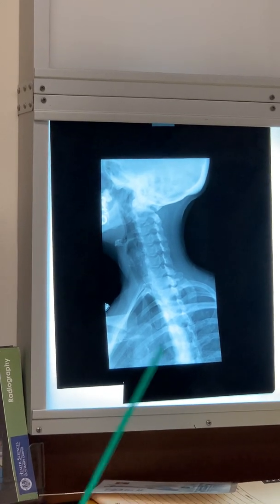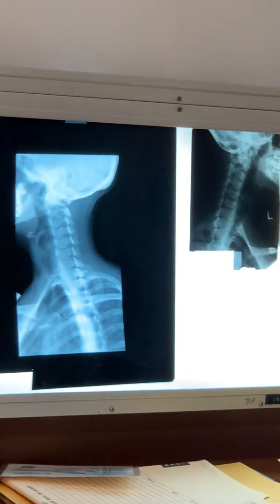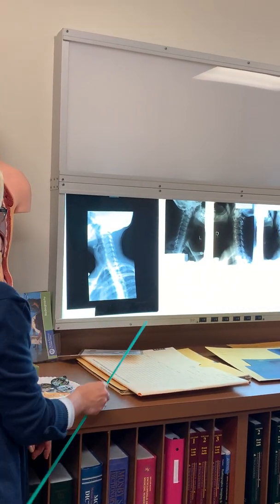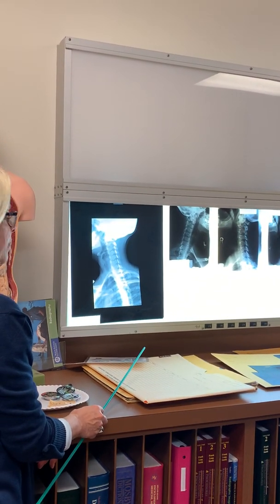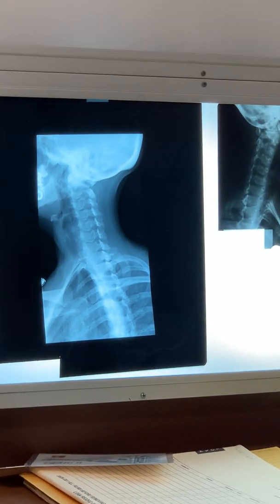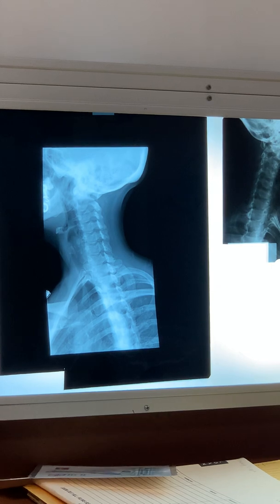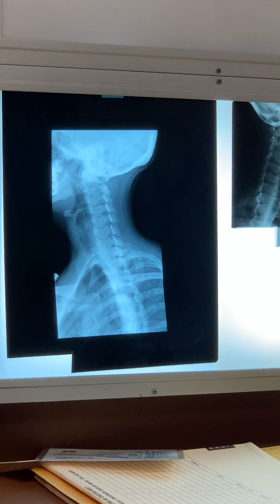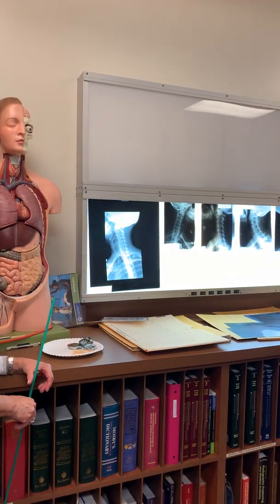Well, if you bring it up, wouldn't the occipital bone that's showing right there get in the way? It would get on that posterior arch. Right. So maybe jut the chin out. Could you do that on a page? Would it get a bigger picture? Yeah, if you could.